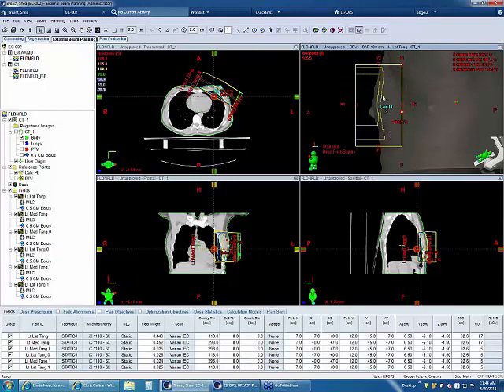We try not to do retroactive. In other words, if you were going to do a third one that went smaller back here, try not to do it. Not that Eclipse can't handle it. It can, and Eclipse doesn't care. The machine might, and I can't say for certain whether or not it will. I'm just saying it might not load at the machine. Eclipse can go back and forth with those MLCs, and it really doesn't care.